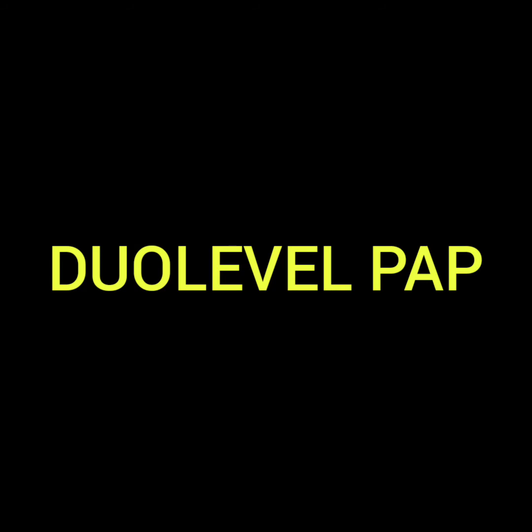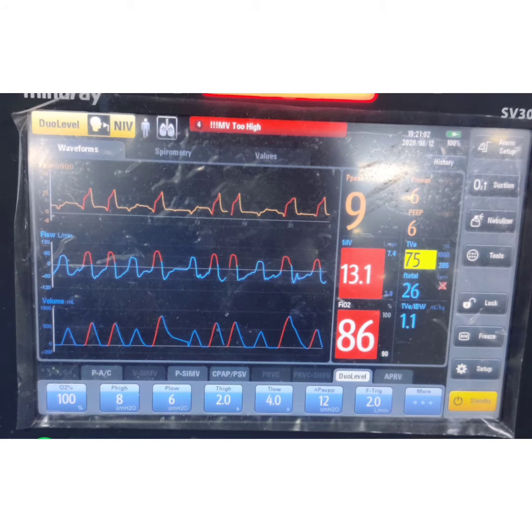So in previous modes of ventilation like BPAP and CPAP, we have seen that the positive wave of pressure indicates inspiration, the downsloping wave indicates expiration, and the flat line indicates end expiration. But in duolevel ventilation, this is not true. In duolevel NIV mode, the time is set for some time where pressure is very high, and for some time where the pressure is very low.